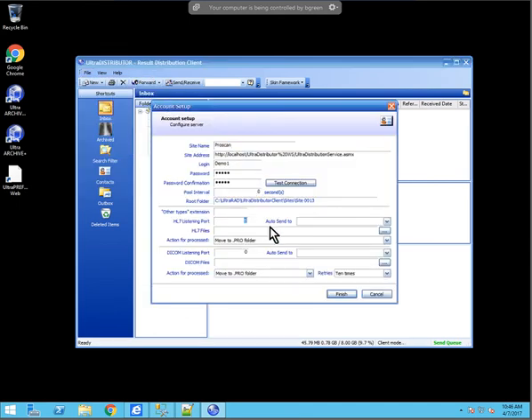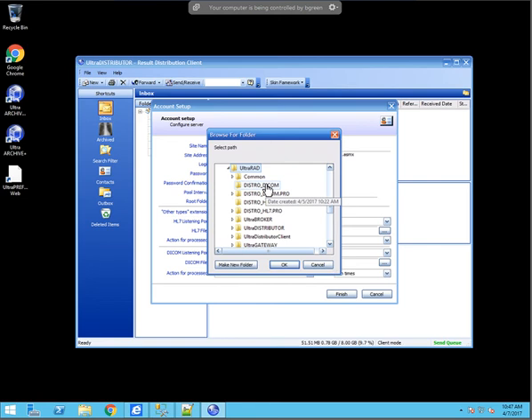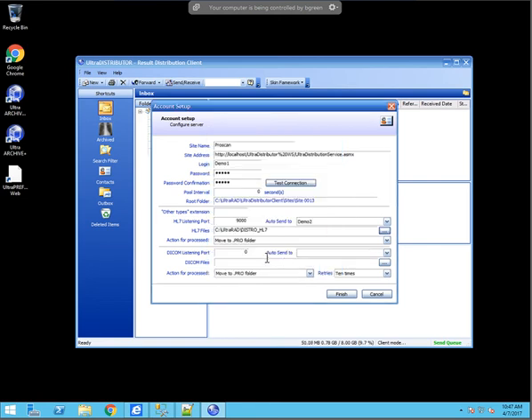So now I could go back in here and I can set up the listening ports. I'm going to set up HL7 to listen on 9000 and forward to Demo 2. Of course, in production, you might have it just say forward to cloud, for example, or forward to whatever the name of your company is, just so that it's easy for people to understand who they're forwarding it to. So I'm just going to set the folders here. So it's going to be HL7.